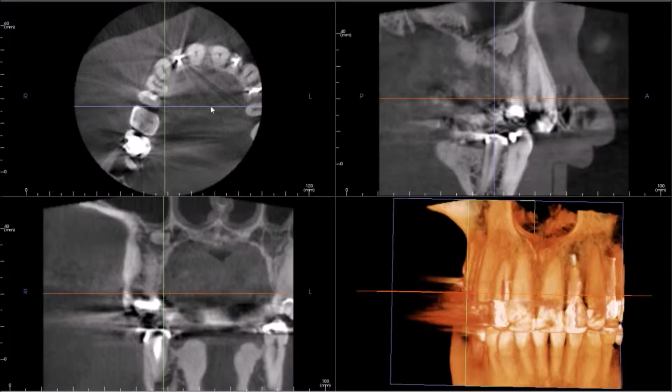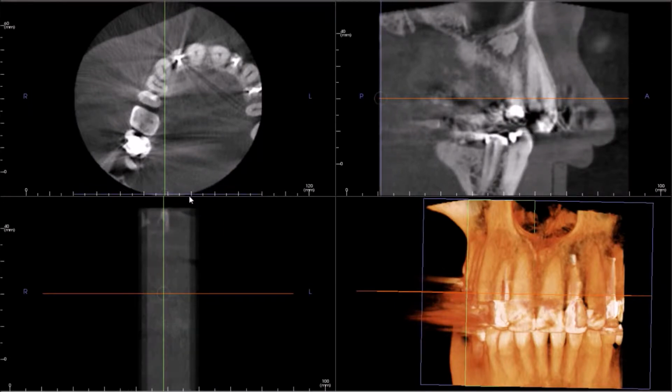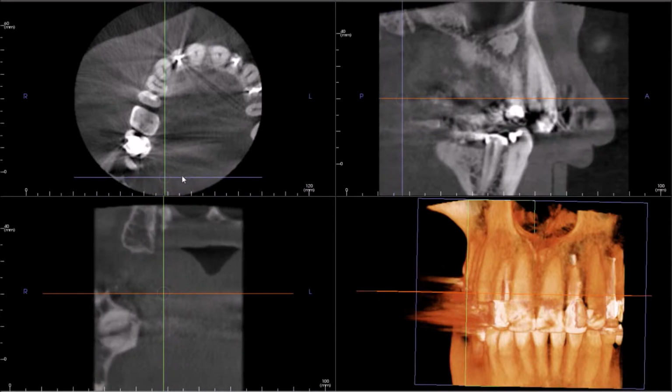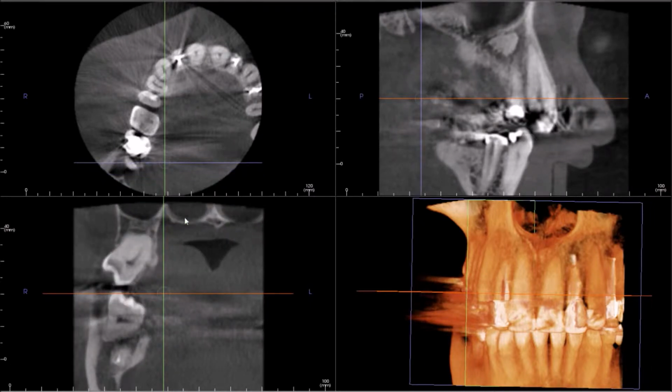And of course, as we review through a cone beam CT, we look at every slice, make sure everything looks normal. And this is a relatively small field of view, so there's not much to look at. You can start to see part of the pterygoid plates here, or the pterygoid process, and then you see the posterior maxilla. You see the greater palatine canal. You see the floor of the nasal cavity. And here lateral to that, you see the maxillary sinus.